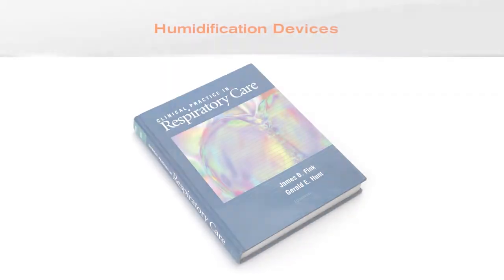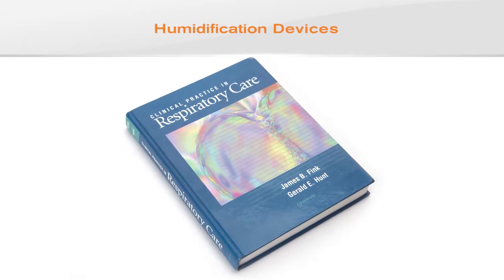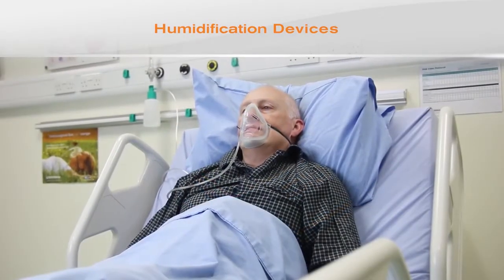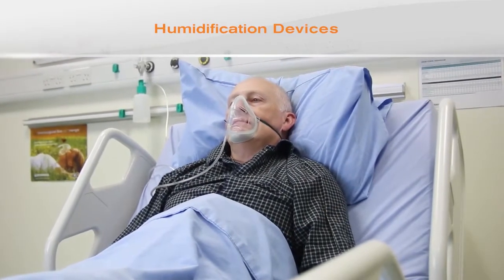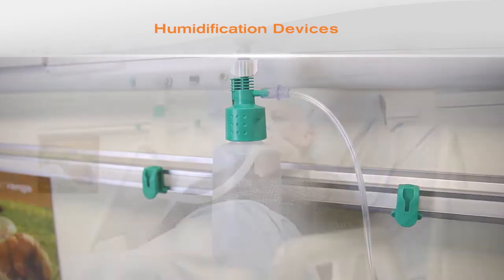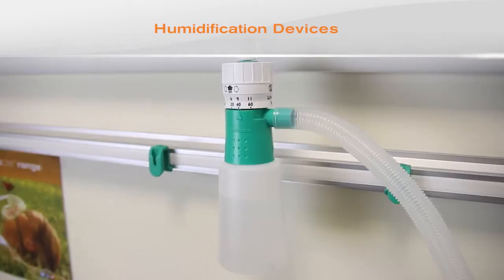Fink and Hunt, in clinical practice in respiratory care, describe the two most commonly used devices in this category as follows. A humidifier is a device that adds molecular water to gas, whereas a nebulizer produces an aerosol or suspension of particles in gas.